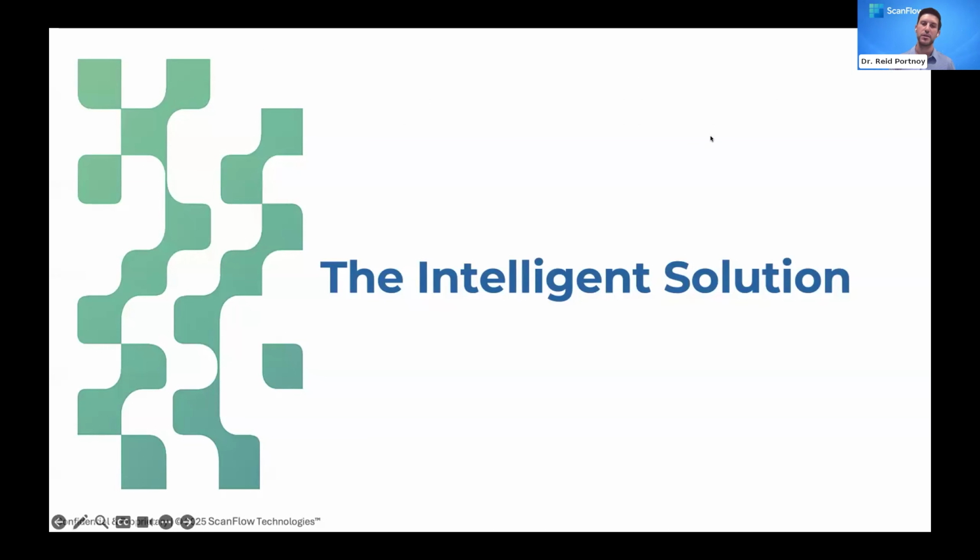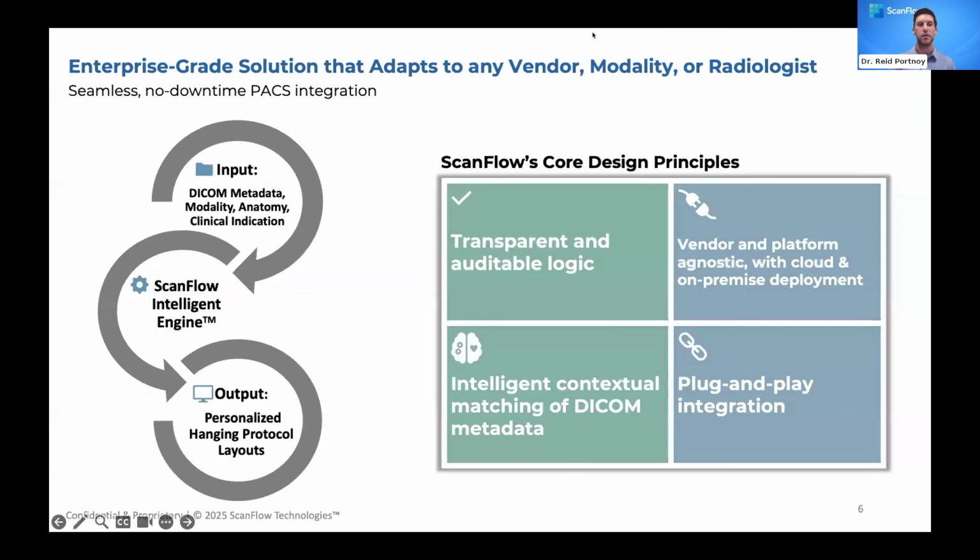So we have the ScanFlow intelligent solution. Our enterprise-grade solution adapts to any vendor, modality, or radiologist. We input the DICOM metadata, the modality, anatomy, and clinical indication into our ScanFlow engine and output a consistent, personalized hanging protocol.